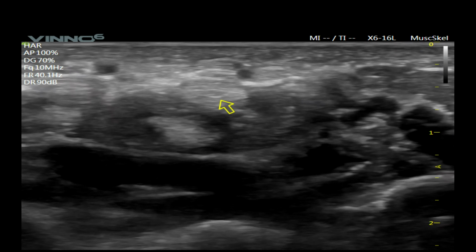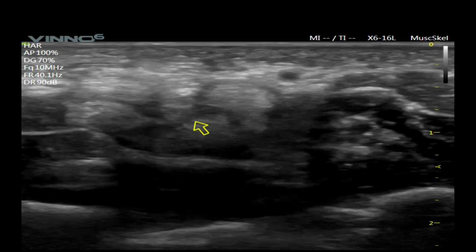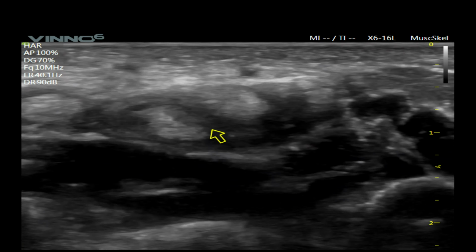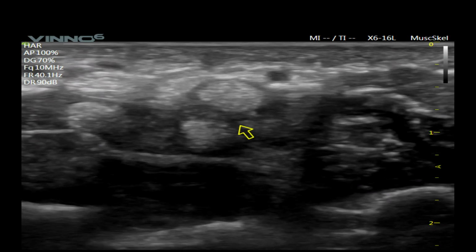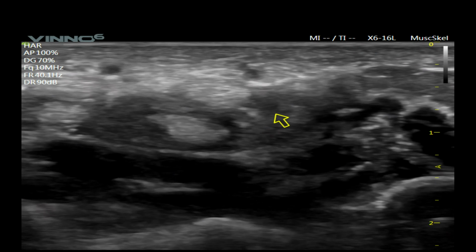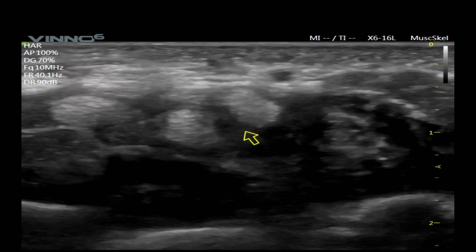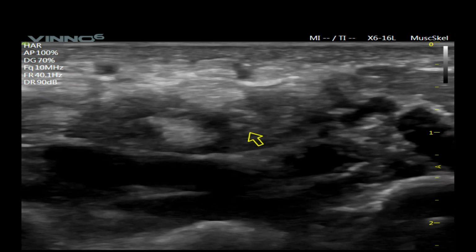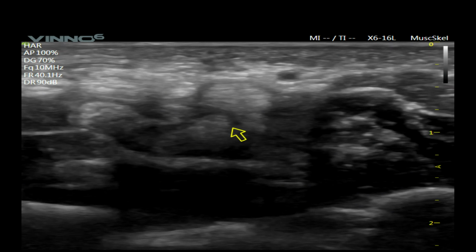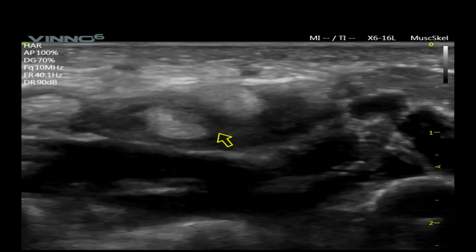This is the same patient in short axis, this being ulnar, this being radial. We have FDS here, FDP in this area. One can see an unstable segment of the FDP just there. There was some debate with some colleagues of whether it could have been a lumbrical tear, with the lumbrical obviously sitting here attaching to the FDP. Our evidence that we've produced in a further slide showing collagen formation, which is likely to be in the FDP, really does support a flexor tear in this case.